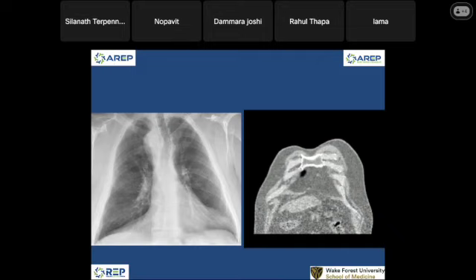Okay, what do we see on chest radiographs? Is this a normal chest? Does it look normal to you? Suppose, I'm gonna make things up here, the patient came just for an annual checkup. Can he go home?